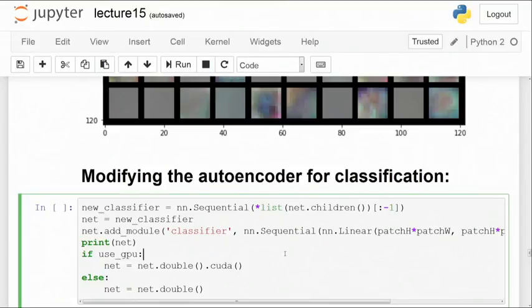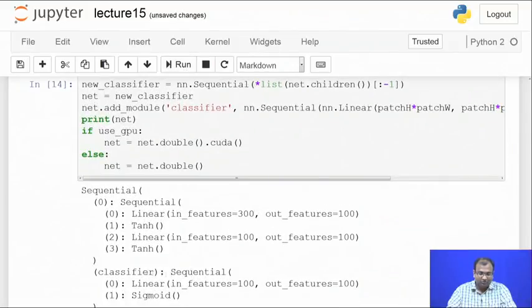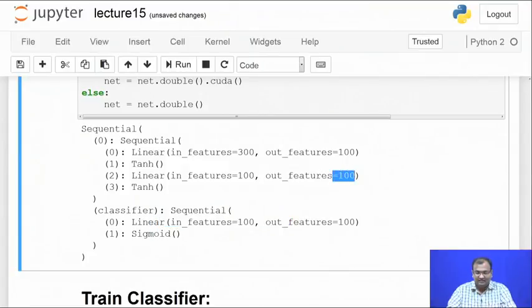Okay. So, as of now the next part comes down that I have trained down my autoencoder, so my representation learning is done. Now, I would need to actually do a classification. Okay. So, I will have to modify my network, I have to throw down everything on my decoder and replace that with just a sequential connection. So, I have my second hidden layer's output which is just 100 neurons, those have to be connected down to 100 such features, because on my output side I have 10 cross 10 map of all the pixels.